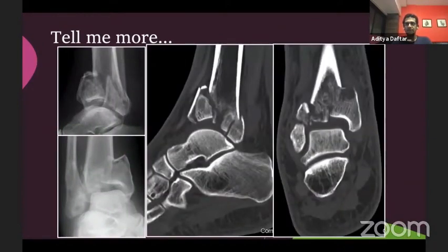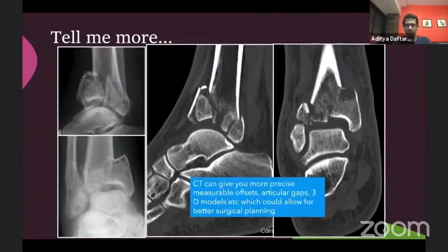When you have fractures like this that extend intra-articularly, it gives you a much better understanding of the intra-articular extension and the step-off. Potentially this has a role to play in how you decide to manage this, especially in today's day and age, with more and more people looking at arthroscopic techniques, open techniques and mini-open techniques. Having a clearer understanding of what the fracture is and what structures are involved is particularly important in helping you decide what kind of management course you would take.